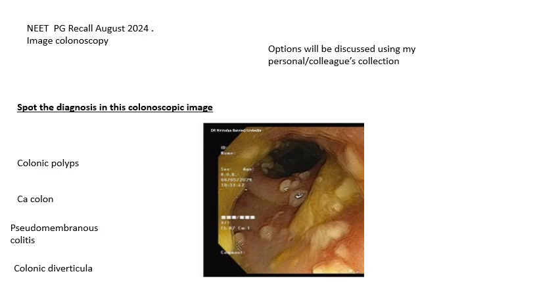They usually don't throw an endoscopic image at you without telling you the part involved, whereas for a CT and an X-ray, they will not tell you this is an X-ray of the chest. But for an endoscopic image, they usually tell you whether it's the large intestine, small intestine, the esophagus, or in the abdominal cavity like your laparoscopy, or a cholangioscopy if you're inside the bile ducts, or a bronchoscopy. So that's very important.